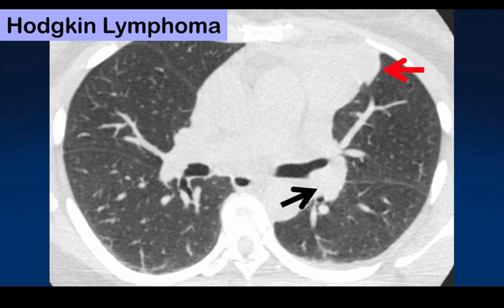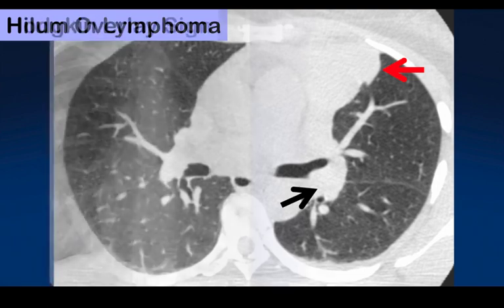The black arrow points out the left lower lobe pulmonary artery, which was clearly seen in contrast to the lung in the left upper and left lower lobes, a CT equivalent of a Hilum overlay sign.